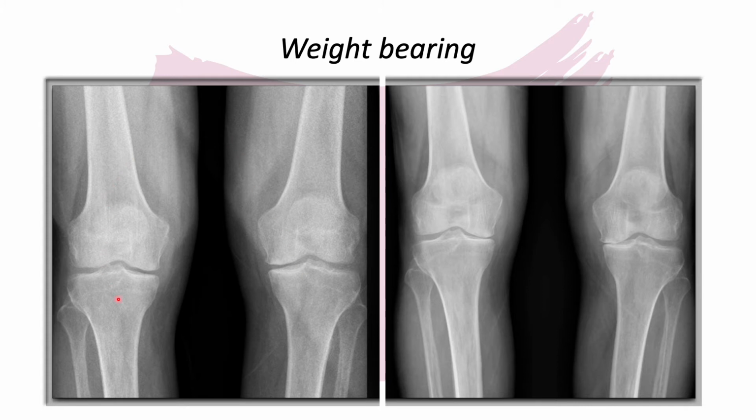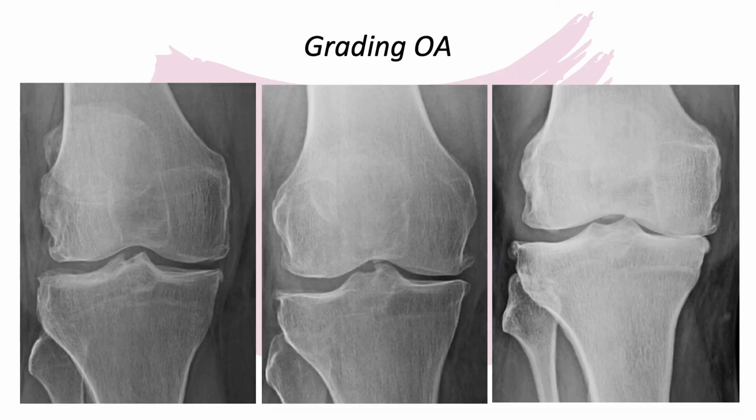If we see these non-weight-bearing radiographs, everything looks good in the joint space, whereas with weight-bearing you can see how there is advanced bilateral medial compartment narrowing. Once we're convinced of the obliquity, the comparison, as well as the weight-bearing nature of the radiographs, we can grade osteoarthritis as mild, moderate, or severe based on the degree of joint space narrowing and marginal osteophyte formation.